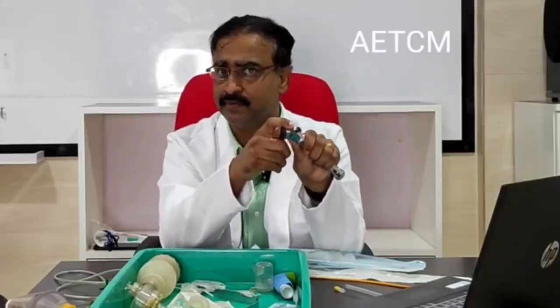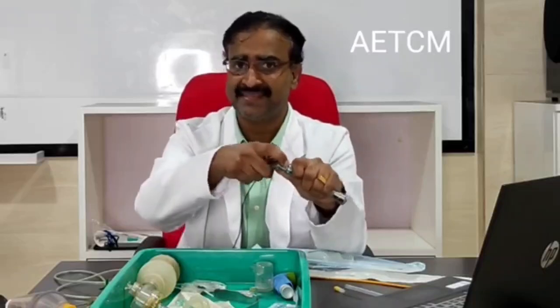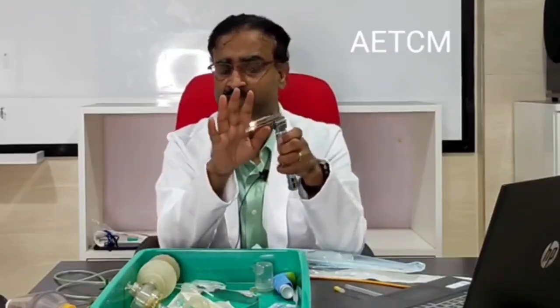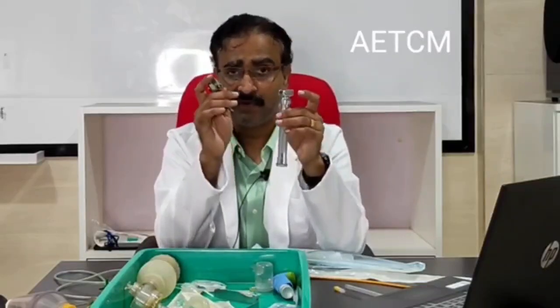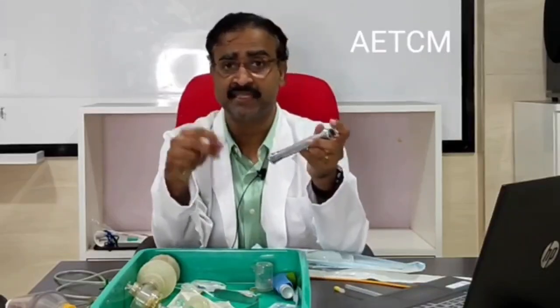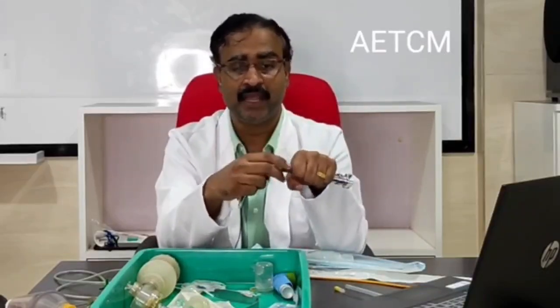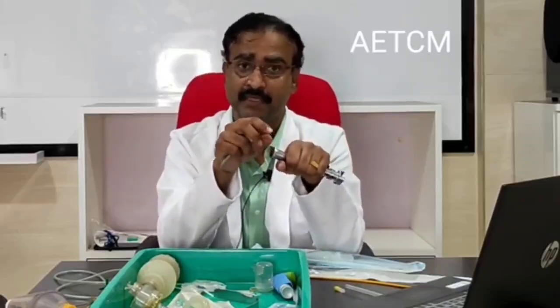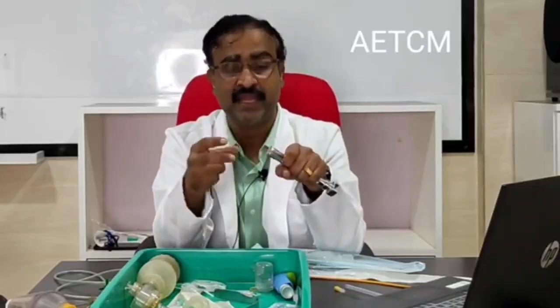You can get a clicking sound, and once that click sound is there, you extend it. Once you extend, you find the light coming out, and that means you're in contact. But the general dictum for the usage of a laryngoscope, which we tell generation after generation, is do check the batteries behind. What happens is the battery that is kept in the back is not positioned properly. To save power they are kept in opposite directions. So that has to be ensured.